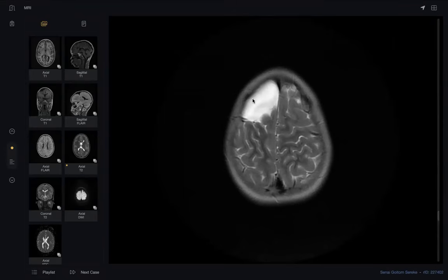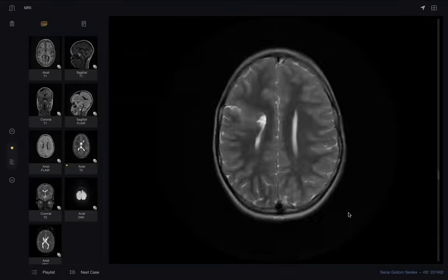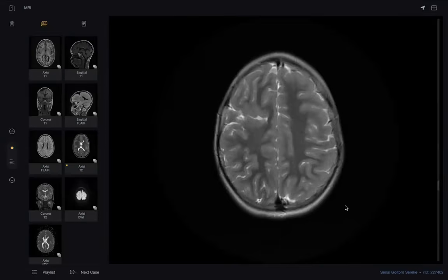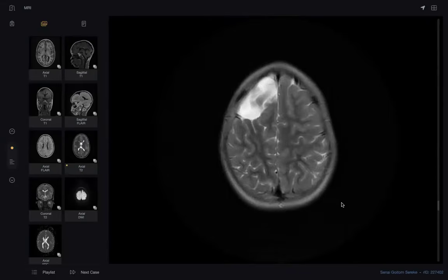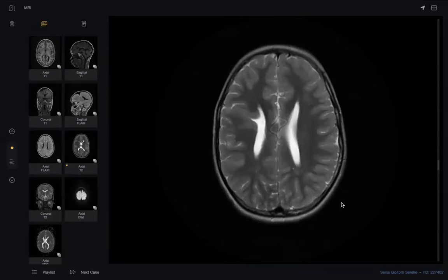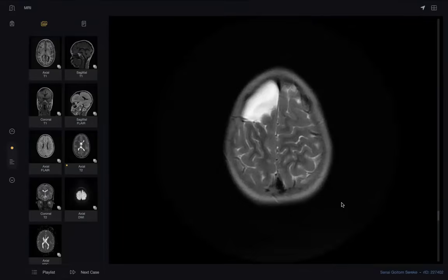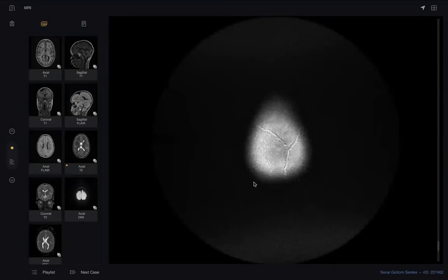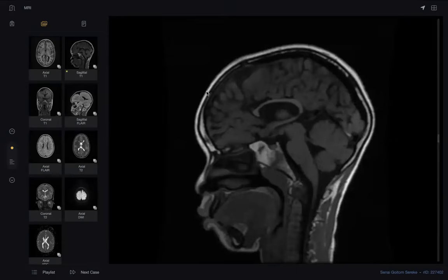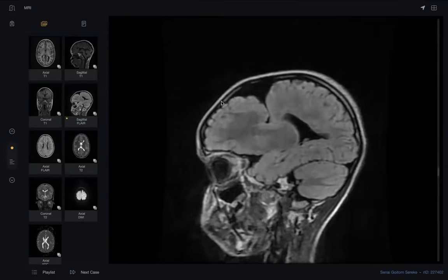What is this? Here I can see there is volume loss. So this is likely an area of, yes, sir, it is a communicating porencephalic cyst formation. Are you sure? Leave the mouse one second. Are you sure this is a porencephalic cyst?